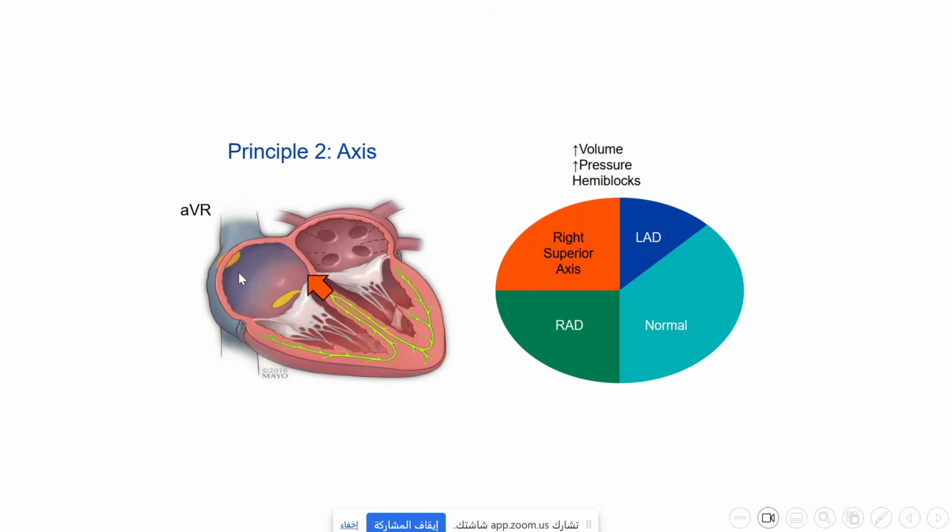You will find lead 1 negative and the inferior leads negative as well. This can't be another kind of wide complex tachycardia. It is impossible with other kinds, because nothing originating from below, from the ventricles, will go up other than ventricular tachycardia.